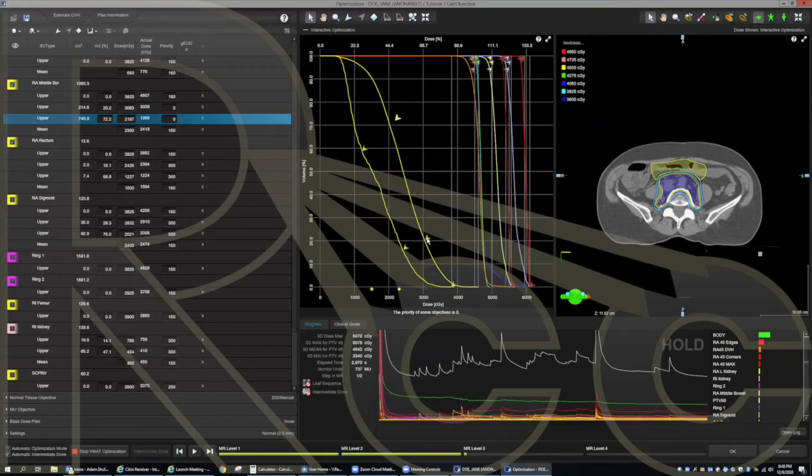So let's say, sorry, I'm just going to show you. These are at 0 priority, so they're not affecting anything. After moving my shoulder, after optimizing my PTVs, all of them look like this still, but this one looks like this. I would say, okay, this one is the one preventing my PTV. So I wouldn't lock it, because my shoulder is still bad. I would move it here and here. And then all of a sudden, you'll see the shoulder will just move right up. So you can easily tell which one is causing the problem.